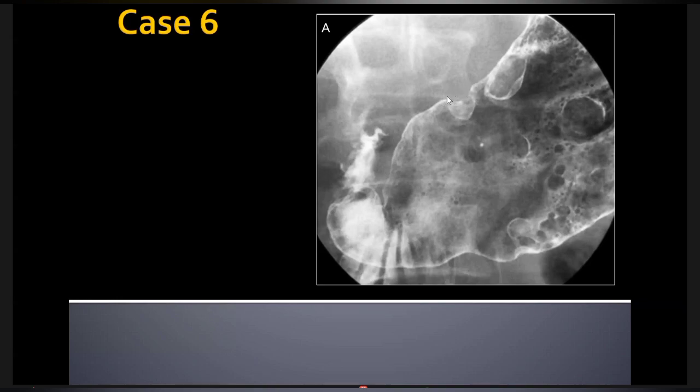You can't see the mucosa here. Why can't we see the mucosa? Because it is invaded by the ulcer. That is the ulcer. That is the meniscus sign, Carman's meniscus, because of its mural inflammation. Okay, I'm going to stop you there. So what I was getting at is the mucosa is raised.